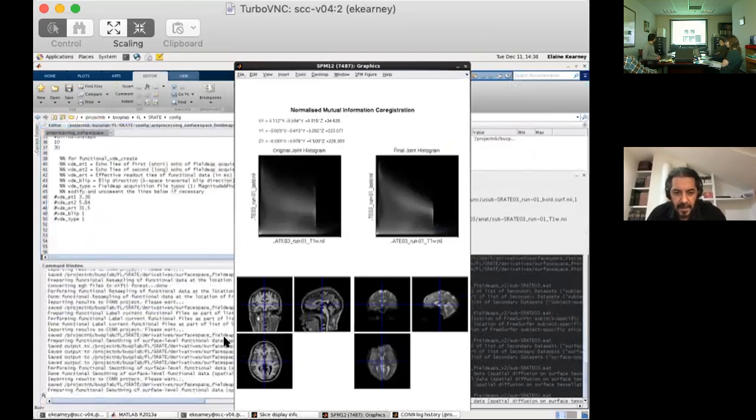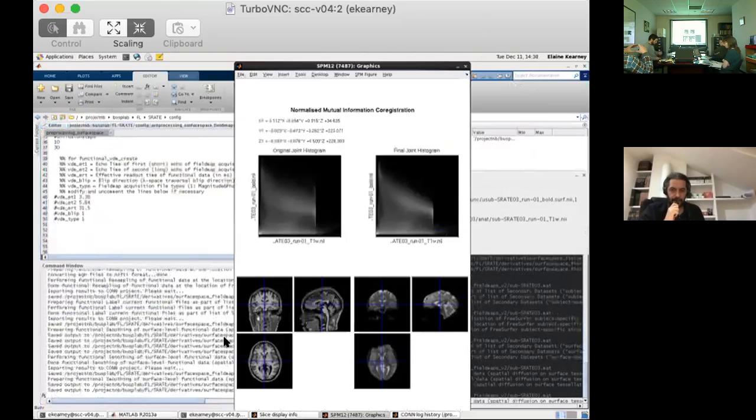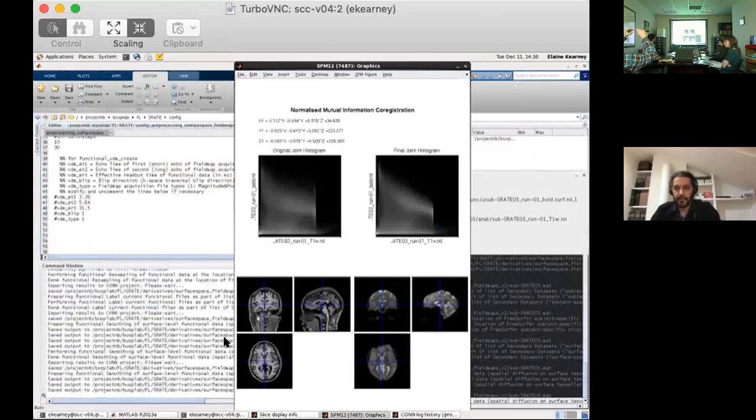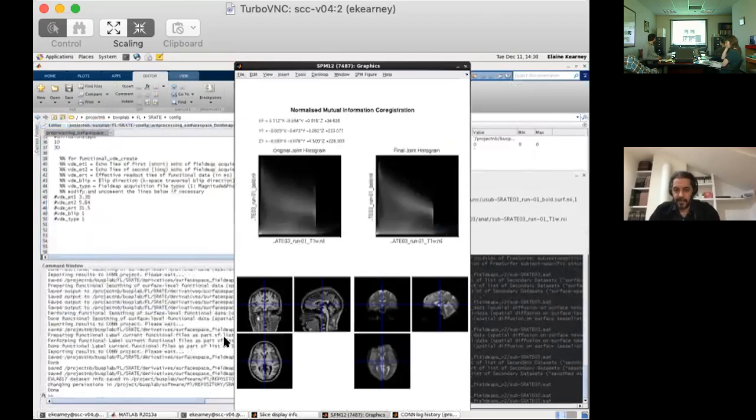Right. My understanding of what happens here is that the warping is really in how the signal is mapped spatially into the volume or on a slice. So at the anterior portions of the brain you get a mapping of the signal from voxels that are within the brain to a position that's more posterior. So it looks like it's squishing the front of the brain in.